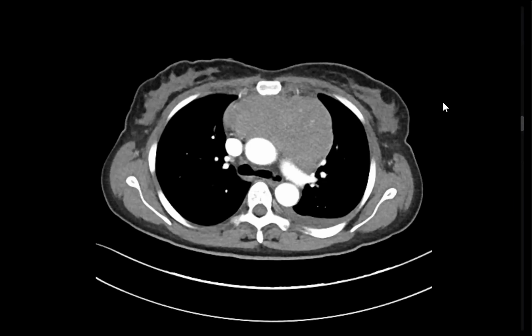The patient has history of travel. TB. Tuberculosis. Good. But he has history of travel to USA.